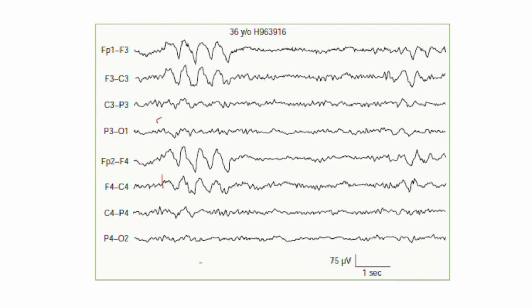Diagnostic context. As the caption notes, generalized spike wave activity occurs elsewhere in this patient's recording. This frontal delta bursting serves as an interictal marker reflecting a generalized, unstable cortex predisposed to tonic-clonic seizures.